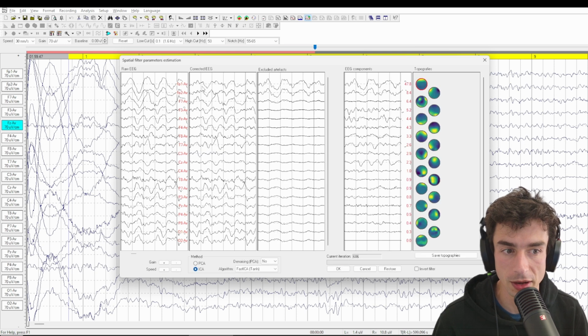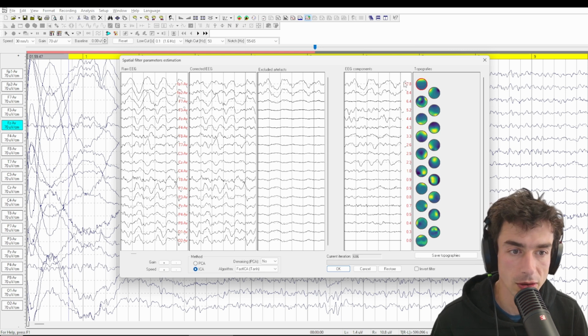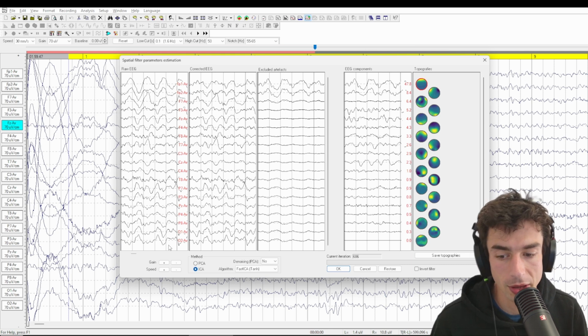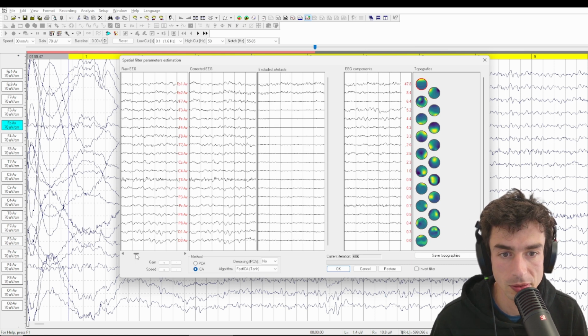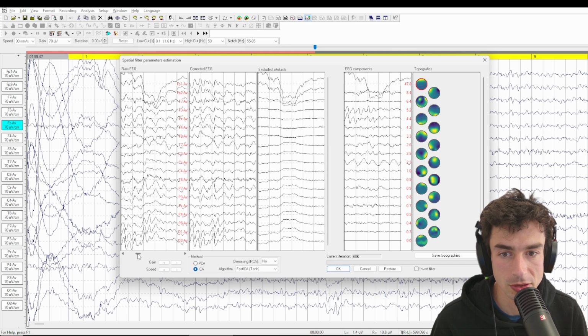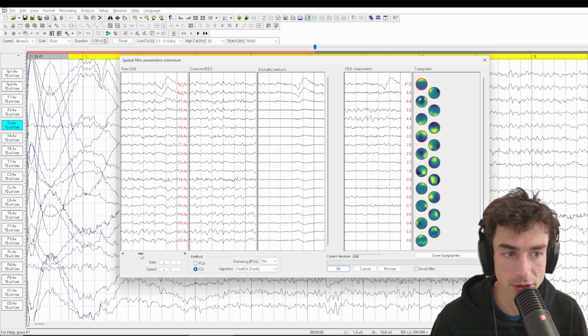And we'll see if the TON algorithm does a better job. And the short answer is no. However, I'm okay with taking this out because the frontal midline theta is really quite visible on its own when it is happening. And it's more useful for us to get it out.